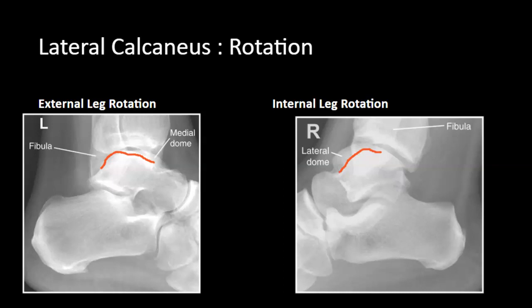Okay, and the anterior distal fibula is aligned more anteriorly to the mid tibia on the resulting projection, and you can see that that fibula moved anteriorly. So this is when your heel is down and your toes are pointing up. So utilize your anatomic structures and your misalignments to determine rotation.